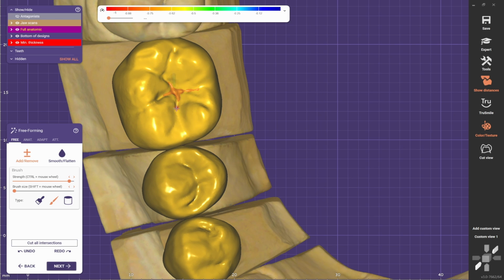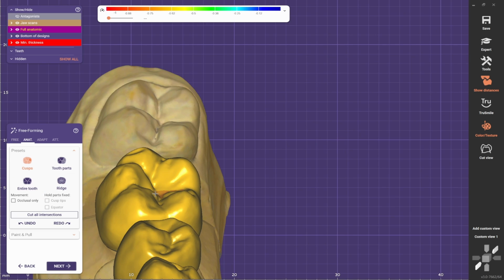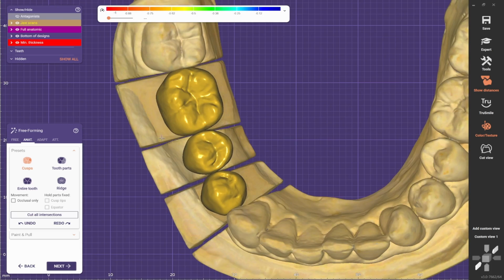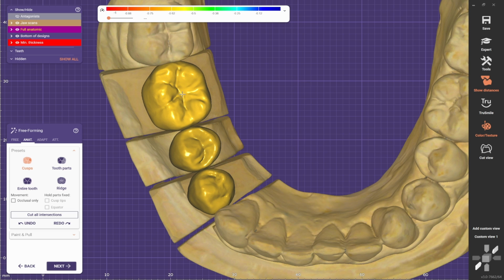So usually for the sulci or the fissures, I like to use the thin tool, brush size at the minimum, strength maximum, and then just come around and play with it. And then you can always smooth a bit out, just not to be as strong. Something like this. You should bring up this a bit more. Yeah. I think we pushed inside too much, it's looking a bit distorted there, so I got a bit this way. Okay. Using this in the right position.